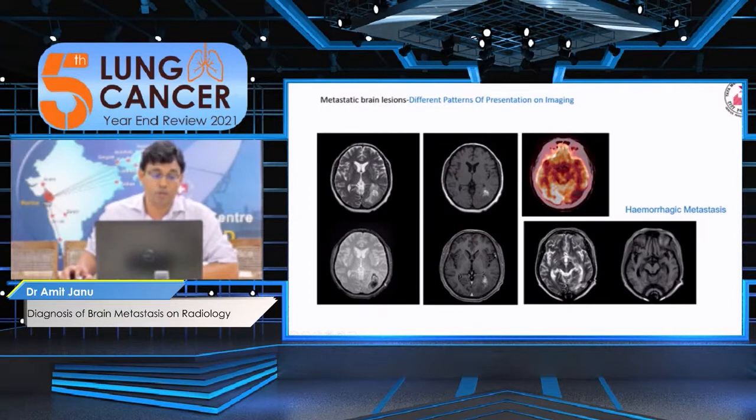But this lesion has progressed over time. So if we give an interval imaging, it will either show enhancement on the post-contrast imaging. These are the two things that we can do for this kind of patients, and then it will tell whether it is metastasis or not. And particularly the additional imaging like perfusion and MRS will not be effective in cases of hemorrhage. So it is a call.